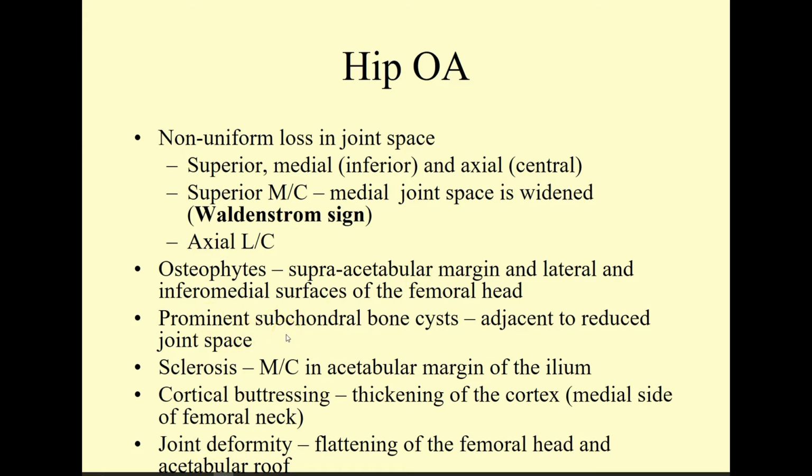Now, we also tend to see subchondral bone cysts. Again, go back to the erosion phase of degenerative joint disease, where we've got fragmentation of cartilage, where that thins the cartilage protection for the underlying bone. And again, remember, these joint spaces are filled with fluid. It's a hydraulic scenario, and we can hydraulically inject, just with normal use of the joint, synovial fluid through these weakened and thinned articular cartilage components, and we can chamber out or see chambers of synovial fluid, and usually blood mixed in there because there's some displacement and fracture of trabecular bone and displacement of marrow and so on.